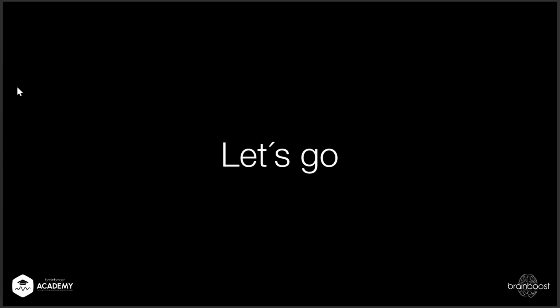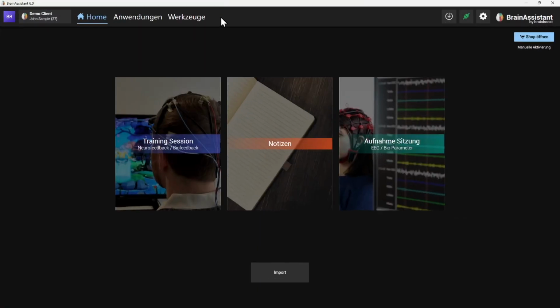Now, let's go. Let's start with how you can create your own flow. Very important: with all devices except the Mind Media devices, you can do this.